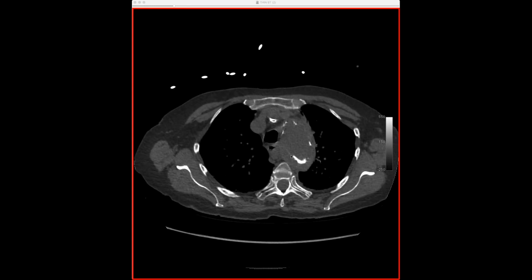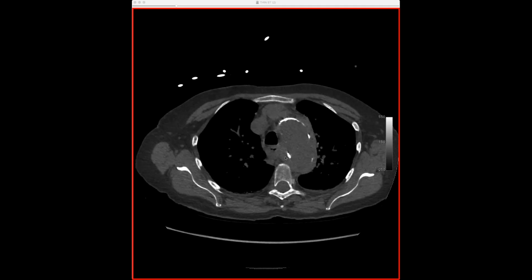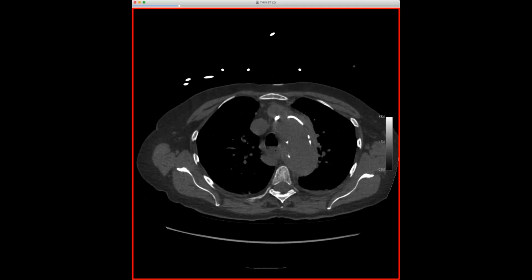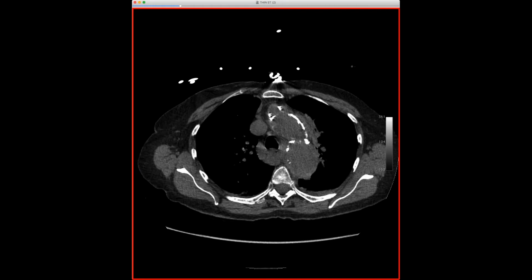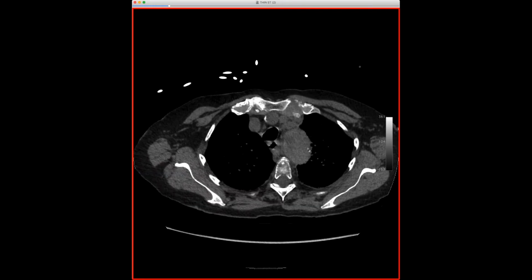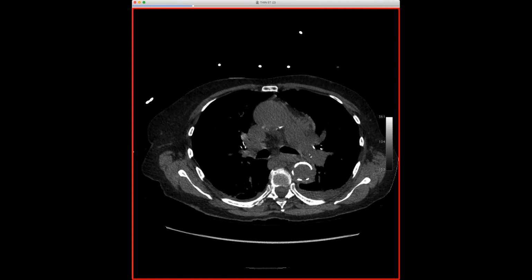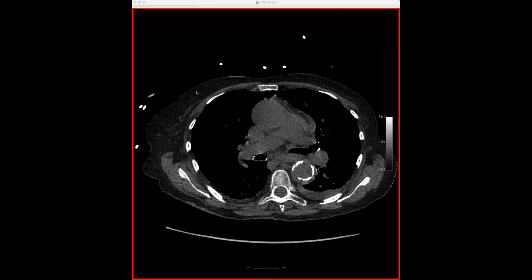So here we can see the displaced intimal calcifications, and there's clearly intramural hematoma. It's not particularly high attenuation, maybe a little bit. Some of that's artifact, but maybe up here you see it's a little bit denser. So we have an intramural hematoma, and it's involving the descending aorta. What's more interesting is the contrast study.